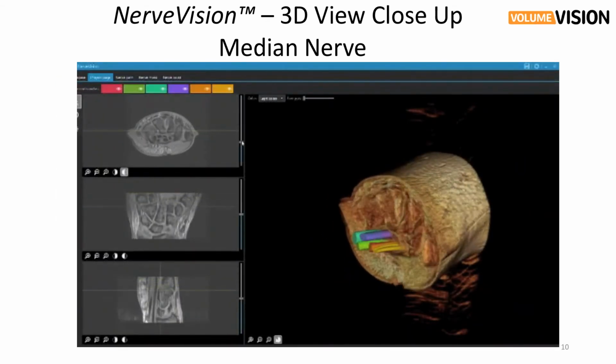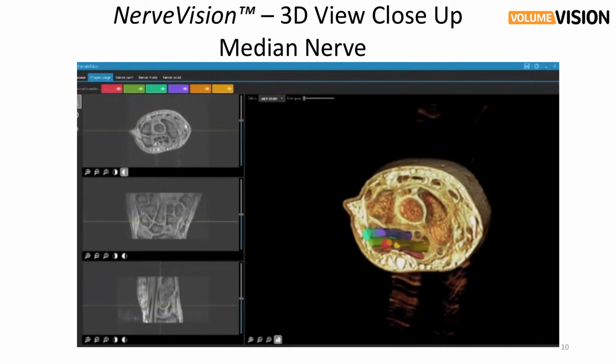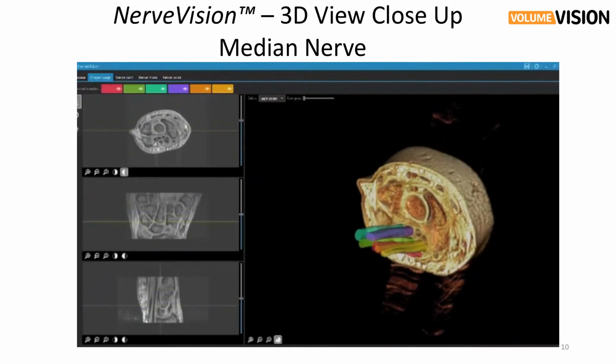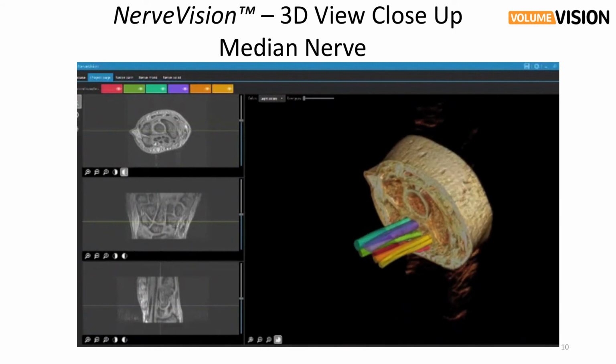What we are showing here is a video of what's called clipping, which is when you remove the anatomy overlying the segmented structures to expose it so that the clinician can rotate it and look at all sides to examine for pathology. This is definitely something that can't be done from standard 2D MRI imaging and is one of the added functions of having a 3D volume rendered reconstructed platform.